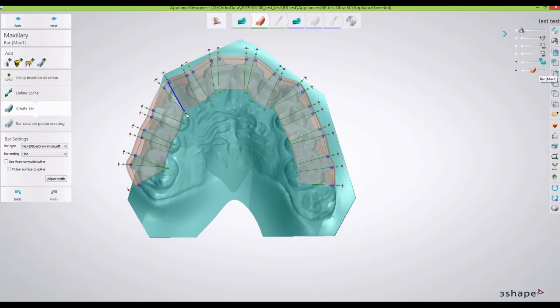If you want to get fancy and fill in any places and make it nice and smooth, wherever you have those green lines, you can move those if you'd like to. If you want more coverage on the occlusal surface, that's something you can set up for yourself. Usually I'll keep it right about here, and I don't worry that it's not rounded. I'll usually keep it flat. If you'd like it to round around, just go ahead and you can wrap around.